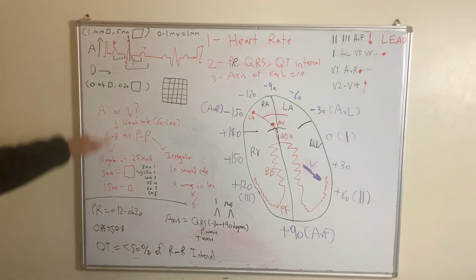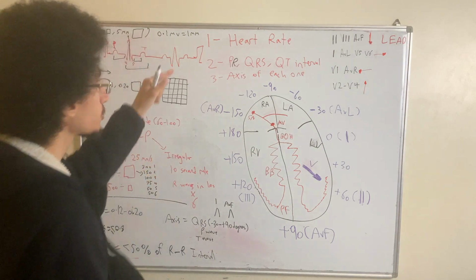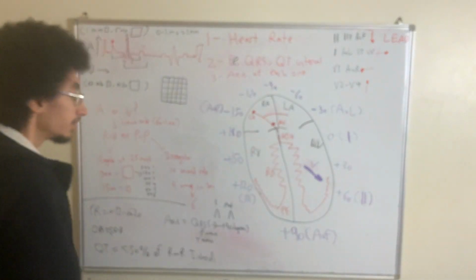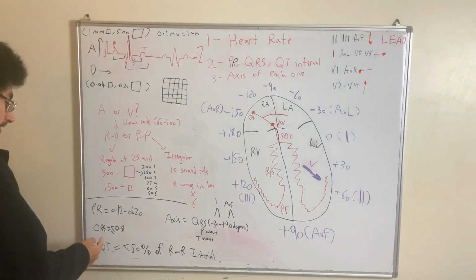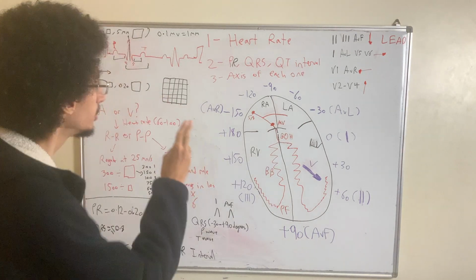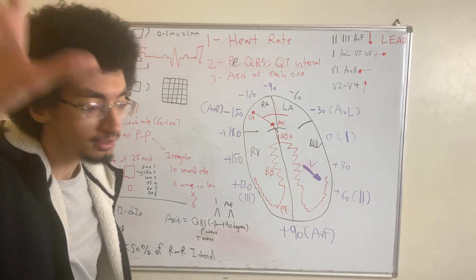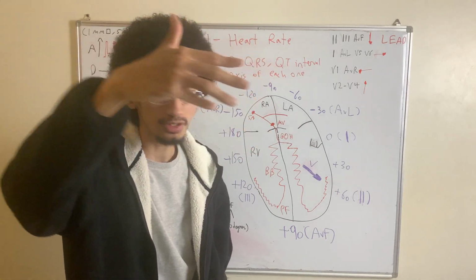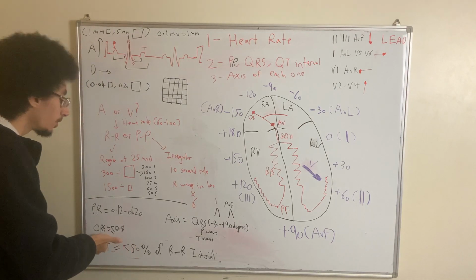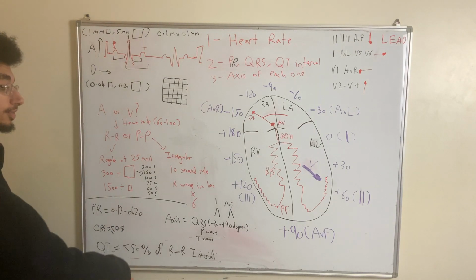What about the QRS? The QRS should be narrow. When you look at it, it should be narrow, like in this drawing, or in this drawing as well. So the normal duration is 0.08 seconds or less, an equivalent of 2 small squares. You should only see 2 small squares within the QRS complex, because if it's widened, you can see it in wide complex tachycardia. So we have the QRS complex. It should be 0.08 seconds or less. Now, if it's more than that, it's widened.